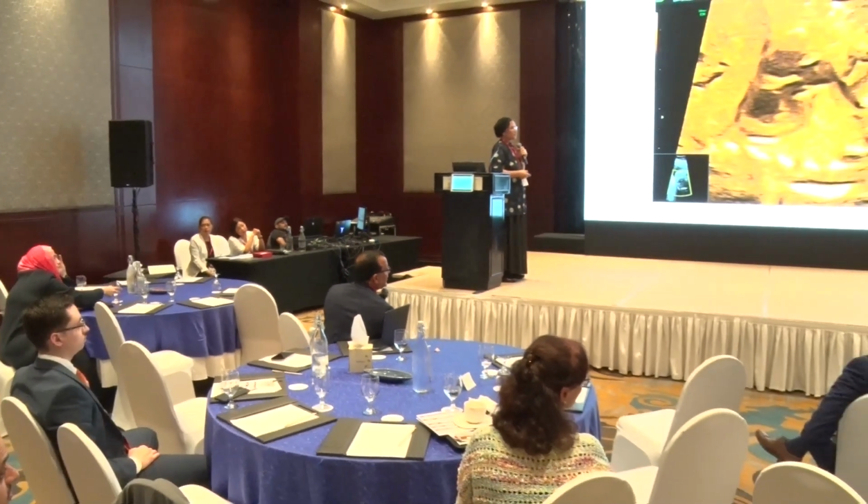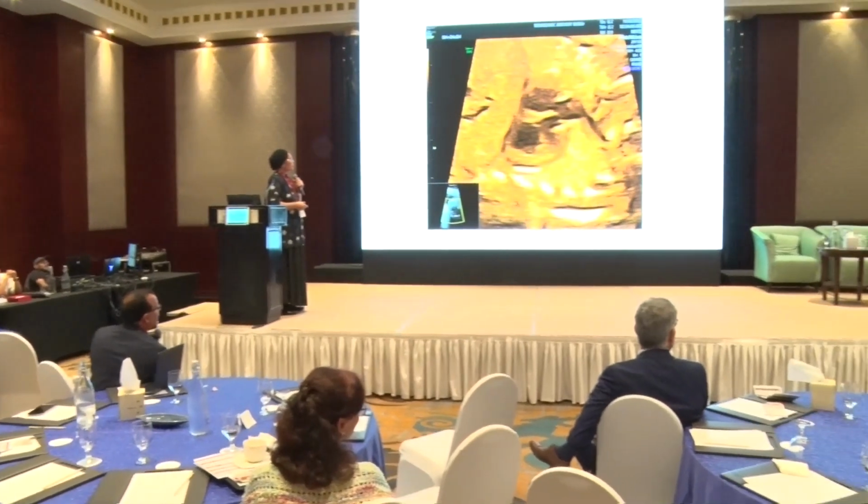I want to add something. It will be a big difference in the postnatal management if it is a truncus type 1 or a tetralogy of Fallot, depending on the PDA. Mostly the truncal valve is not normal. You will find leakage in the valve itself. And we need to see the arch very well, because if there is a vertical duct, it will affect the management after, to start Prostin or not.